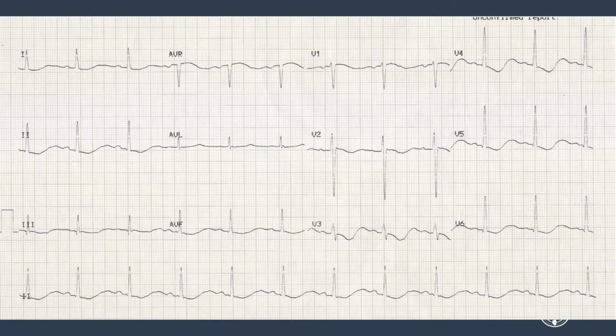If we go to the second ECG though, you'll see the more classical signs of a milder hypokalemia. What we see is an increased amplitude and length of the P wave as the atrial cells react more strongly to the stimulus of the sinus node. The PR interval is classically prolonged due to this. The T wave that we see in this ECG is inverted. It can also simply be flattened, and it is, as in this case, typically followed by a U wave. These are best seen in the precordial leads, and they give the impression that we have a very long QT interval, but what we're actually looking at is a very long QU time.